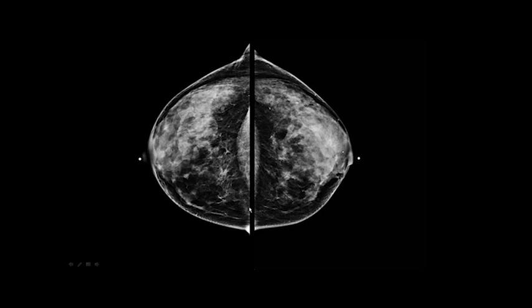You want that black circle all the way around. You want your breast symmetrical on both sides. You want good medial tissue. You want good lateral tissue without folds. You want to see the end of the parenchymal pattern if possible. The calcifications are sharp in structures.